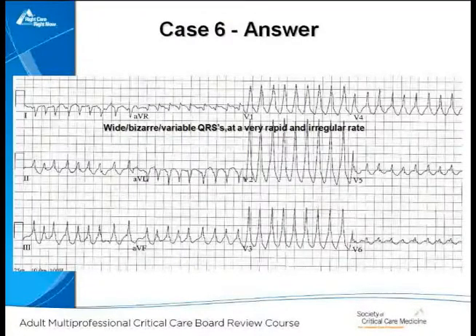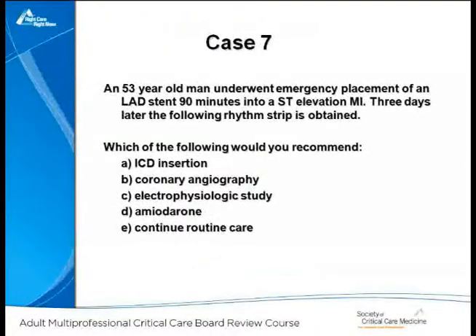Yeah, and Dr. Perillo is reminding me that this is a very common board question. There's all sorts of variety of pre-excited atrial fibrillation. This one is mostly pre-excited, but the key things are the variability in the QRS morphology and the fact that it's irregularly irregular. If this was dead-on regular, it becomes much more of a problem, but you've got to look for these minor irregularities.